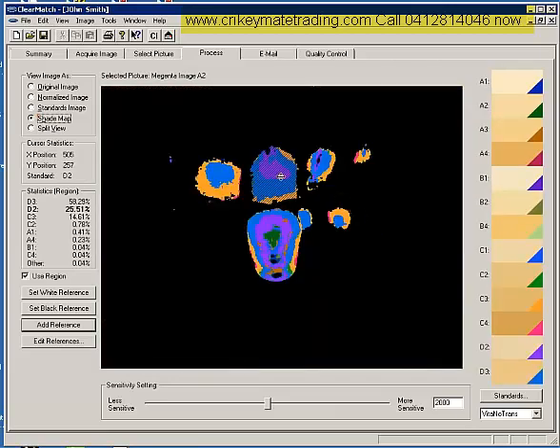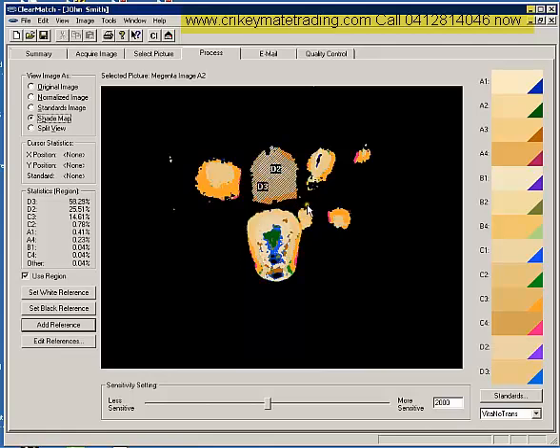So here we have it now, and if we go to the shade map now, I'm just going to get rid of these labels. You can see that is a D2. You see when I run the mouse over that? So that is light translucency over a D2 standard. So I'll just click on that, and the rest was translucency over a D3 standard. And I'm just going to ignore that because we know that's dark translucency derived from the D3. So here you would just overlay the dark translucency, or you might get the lab just to opaque it darker and then cut in over here depending on the materials they use.